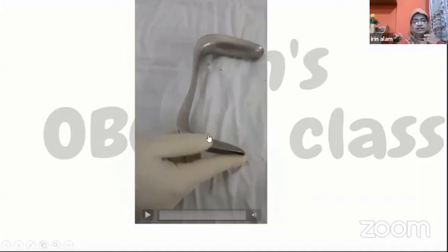It needs one assistant to hold this. And in obstetrics, this is used to detect PROM. If we use this instrument, then we have to retract the anterior vaginal wall with another instrument. During PPH, we can expose the vagina with this instrument, and these are the uses. And if there is any retained product of conception, it can be used, also in gynae.